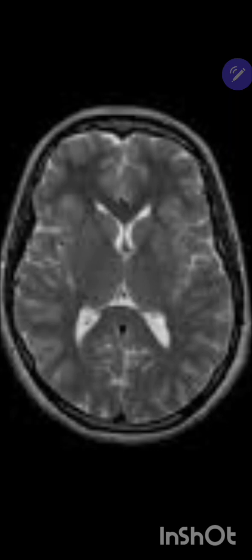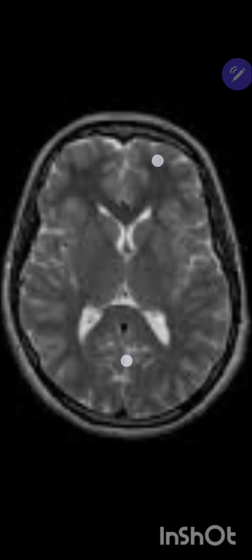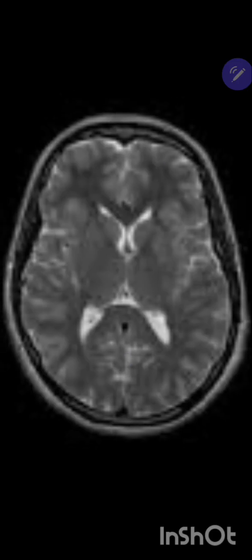And this image is the MRI image, magnetic resonance imaging. How can we identify that this is the MRI scannogram? On the periphery, there is a thin layer, a thin white reflection, the outer part of the bone, and the inner structures. These are the soft tissues and different cavities, with different lobes, all visible.